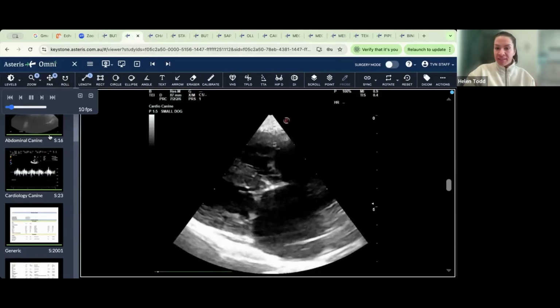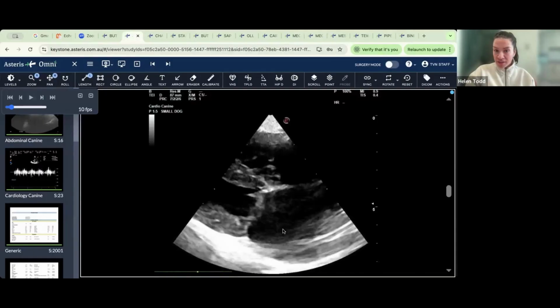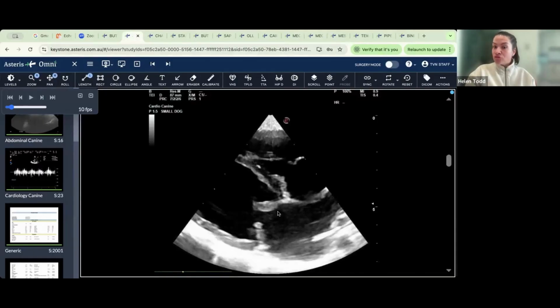If we look at it compared to this big, disgusting, vegetated, chunky leaflet, he's really like a little club now, this septal leaflet. We've got an incredibly rounded and abnormal septal leaflet. So just subjectively, we can call that mitral valve thickened.